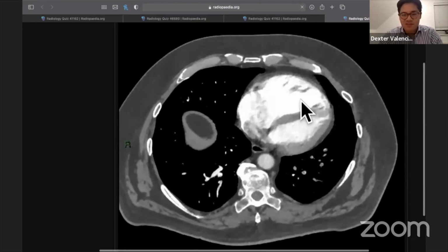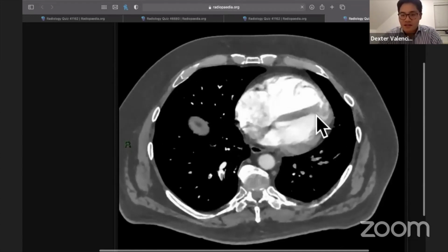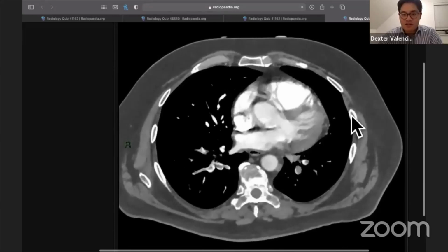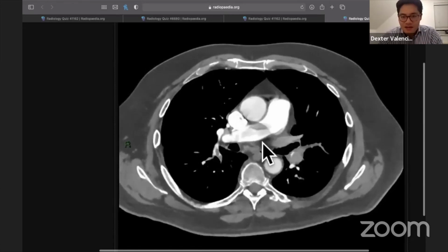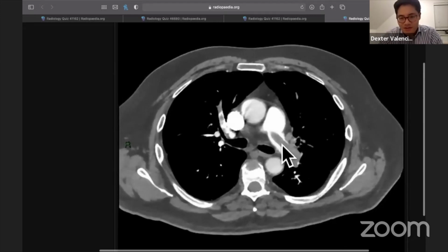It's our right ventricle. It's looking a bit big, so it's a bit worrying. We can see that this interventricular septum is straightened. You could argue maybe it's starting to curve towards the left again. Are we going to be seeing some right heart strain? And if we come to our main pulmonary artery, as we scan through the right, there's this linear filling defect here, which I'm a bit concerned about. That looks a bit abnormal. And as we go into the left, we can see that there's this clear linear filling defect, which is a thrombus or pulmonary embolus.